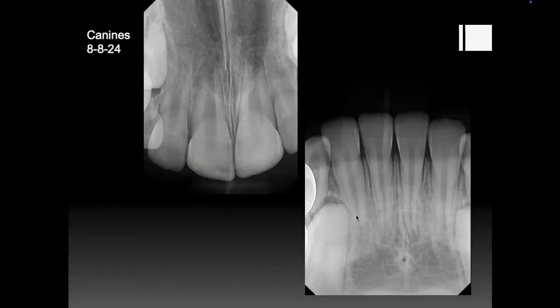All right. Yeah, so zooming in, we have some canine photos, upper canine, lower canine. I know they're really hard to see. We only take 2 anterior PAs. That's okay. I don't take any PAs. Okay, beautiful. So just based off what I was seeing, it looks like the canines are in a decent eruption pattern as far as the position of where they're coming in, but they may potentially end up becoming trapped. Okay, and we'll be able to see it a little bit better on the pano as well.